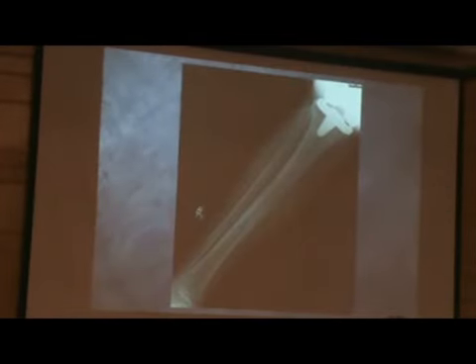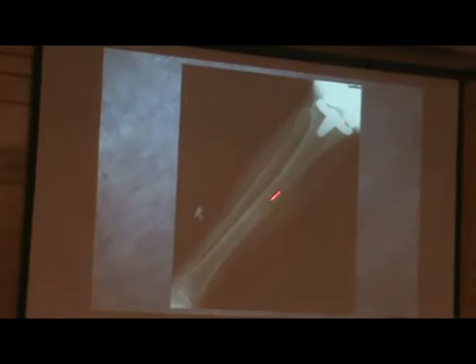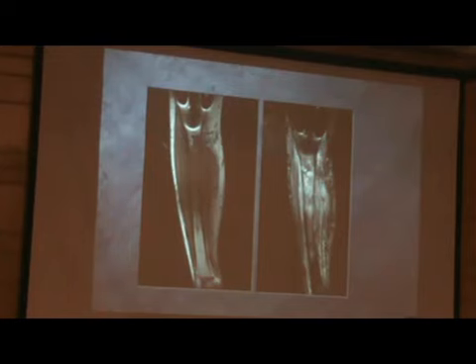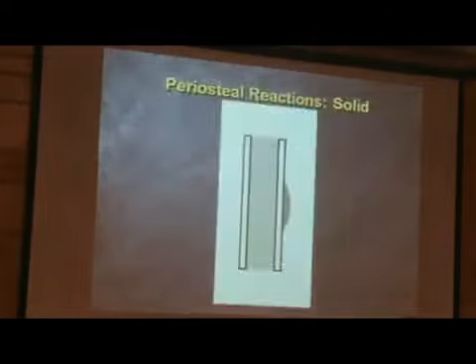Here's an older patient, 56-year-old with total arthroplasty and leg pain. You can appreciate that there are some ill-defined lucencies in this tibial shaft. When an MR was done, you can see that it was just the tip of the iceberg, and there's a large infiltrative lesion of the tibial shaft with soft tissue extension. This is quite typical of lymphoma. The age group is typical, as well as the permeative involvement on radiograph and soft tissue mass on MRI.